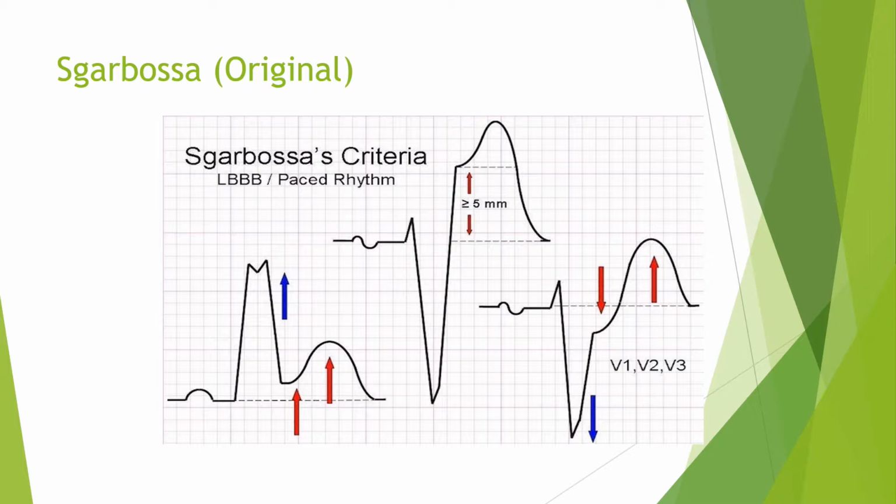Even though the T wave will pull that ST segment, it only can pull it to a certain point. If it exceeds that, and in the original criteria they applied a cap of 5 millimeters, then it's considered positive, it's considered excessively discordant, and that ST elevation has to be the indication of an underlying acute MI in the presence of a left bundle.